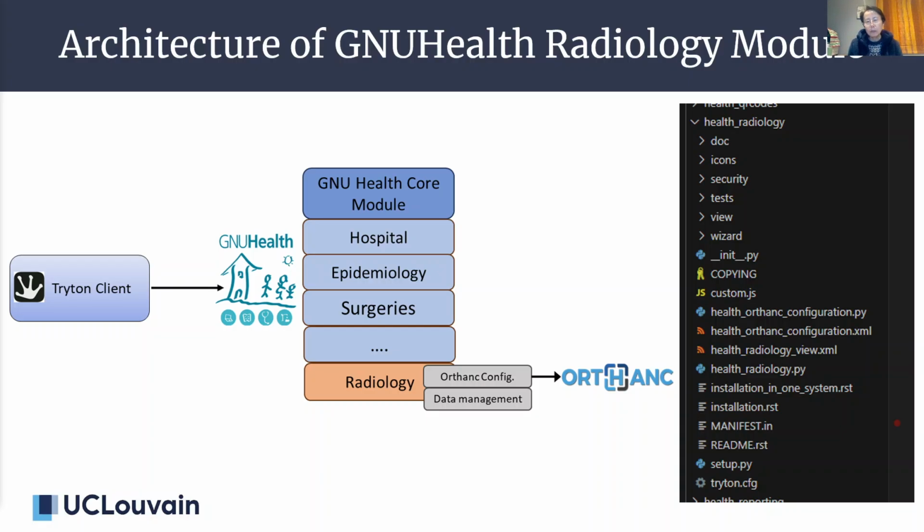This is the new architecture of the radiology model that I created. It has two main functionalities: data management and Orthanc server configuration. The development follows the structure guided by the GNU Health system.